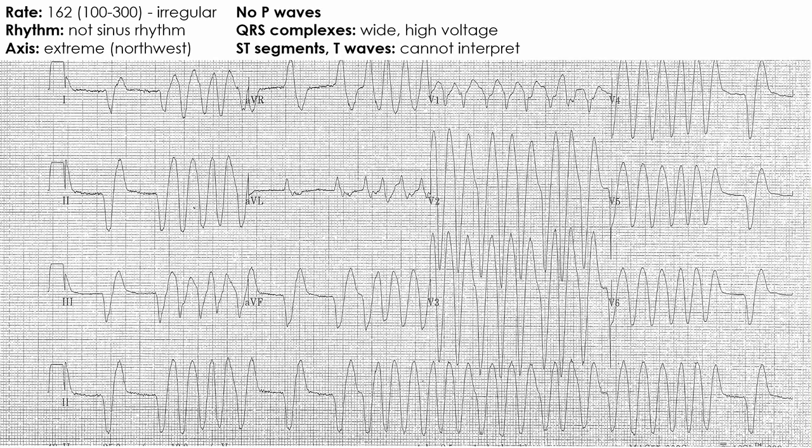There are no P waves, and again, that's useful because if you do have ventricular tachycardia, you do sometimes see P waves, and what you should see in a true ventricular tachycardia is that they have no relation to the QRS complexes. The atria are firing, but it's got no relation to what the ventricles are doing. You've got complete AV dissociation in ventricular tachycardia. Although, in a case like this, you may not have any P waves anyway, and that can happen in VT.